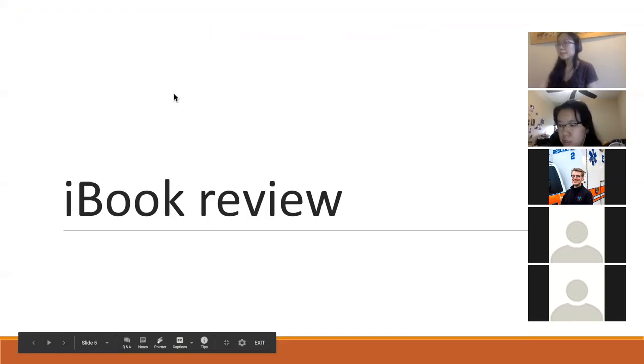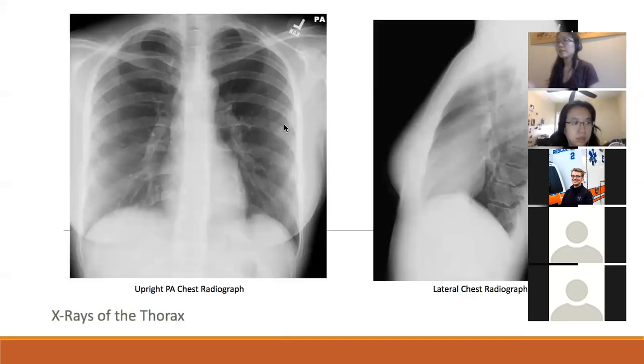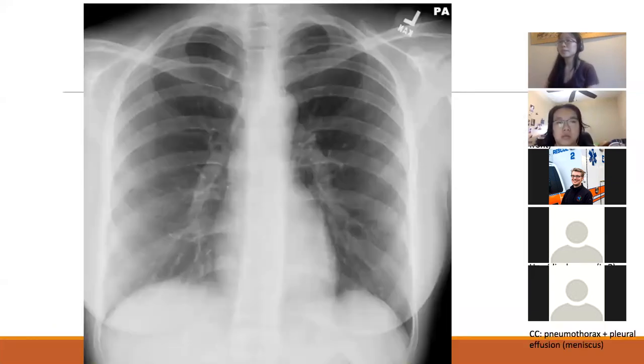All right, so now let's jump into the iBook. On this upcoming exam, you're going to be responsible for 2 chest x-ray views and for 6 cross-sectional CTs. So let's get started with the x-rays.